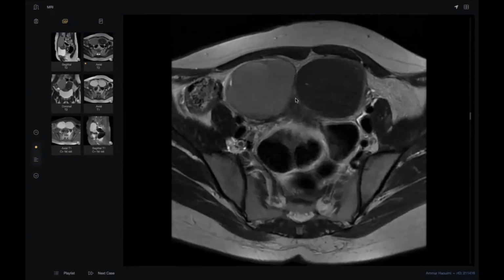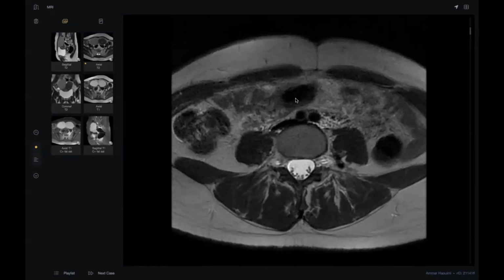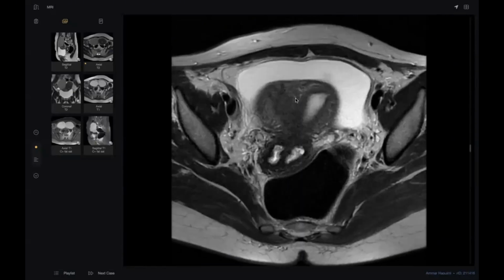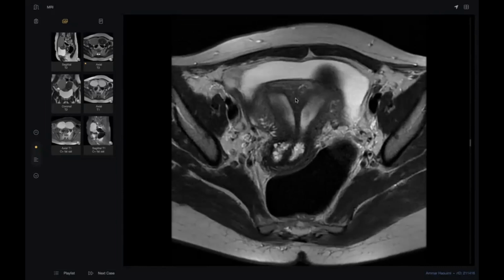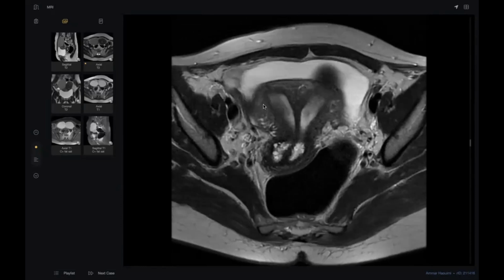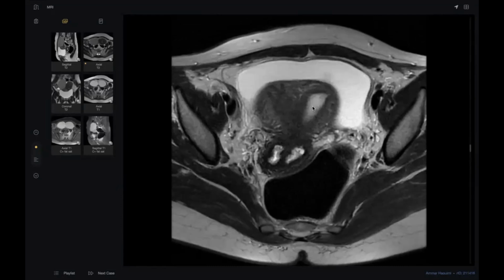Second, look. I will bring one from down. Look, my colleague, here this is a septate uterus. You did very well. This is not didelphys. Why? See here, this is one uterus. And the second point, this is not muscle. This is a fibrous septum.